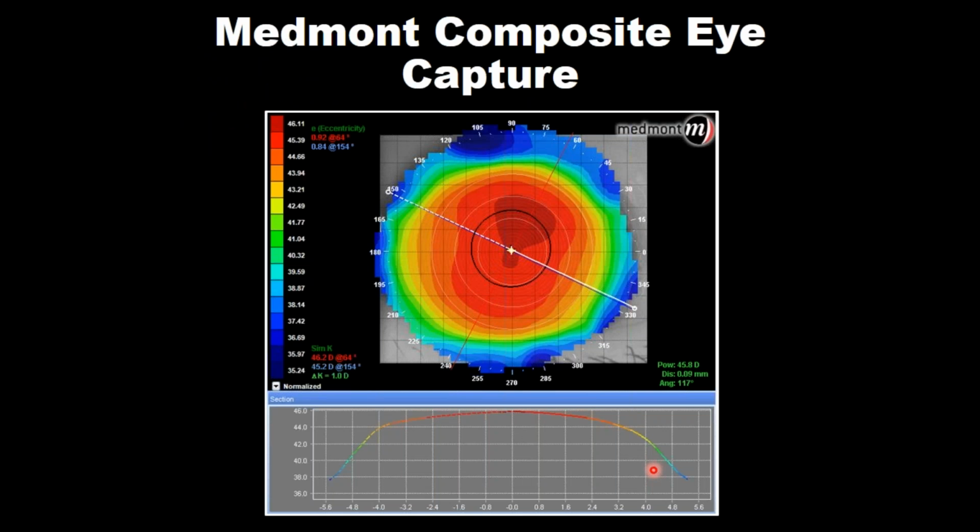So when Graham's trying to assist with the construction of virtually any contact lens, having a composite map gives him the ability to understand the shape of the peripheral cornea. It gives him the ability to understand where the total diameter of the lens may come to rest on the surface of the eye.